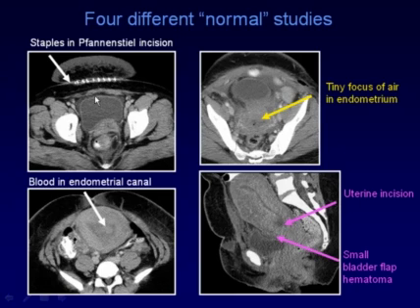This last image is a sagittal reformat of the uterus in a patient a few days after cesarean section. So the front of the patient is here and the spine is in the back. This is a nice sagittal view of the uterus. The low density region right here is where the cesarean cut was performed for the incision, and so that's a normal finding.